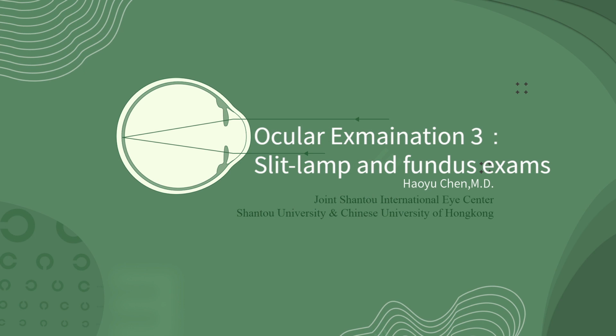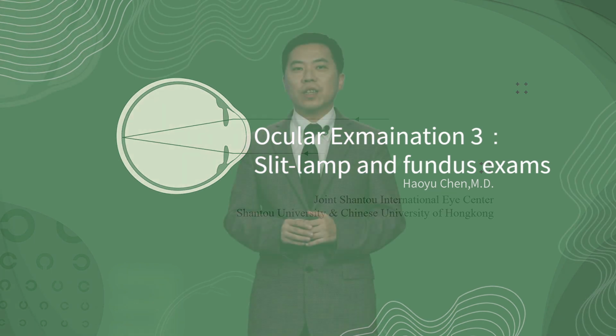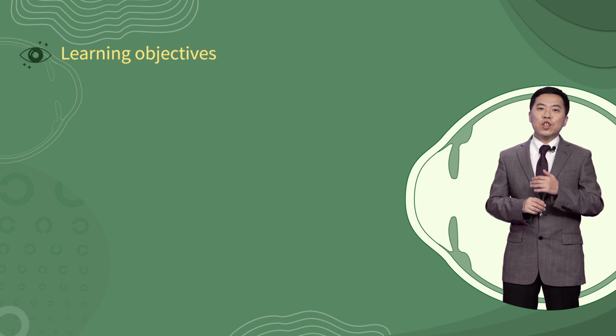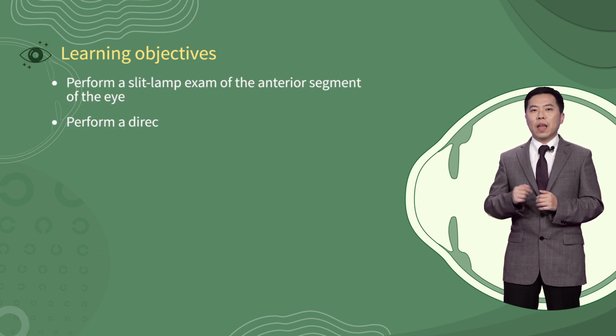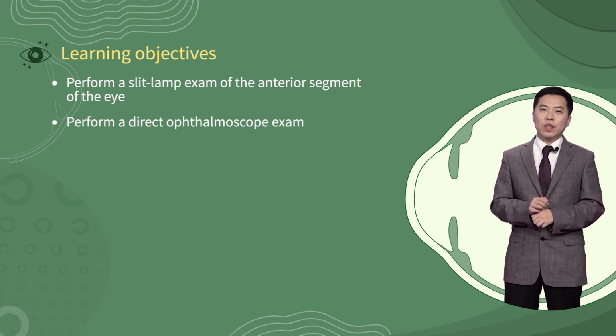Today's topic is part 3 of ocular examination. We will talk about slit lamp and fundus examinations. When we finish this section, you should master the techniques of slit lamp and direct ophthalmoscope examination.